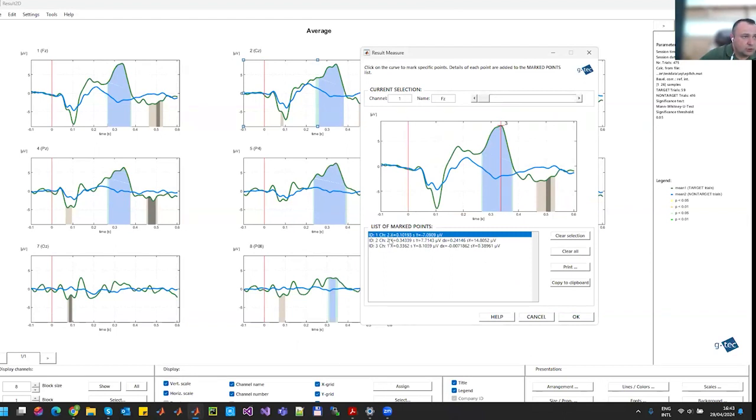Okay, so the third one, the latency, it's again 336 milliseconds for the second one. Yeah, probably it's how I clicked on it. It's again clicking on the graph. So this is a very nice tool.